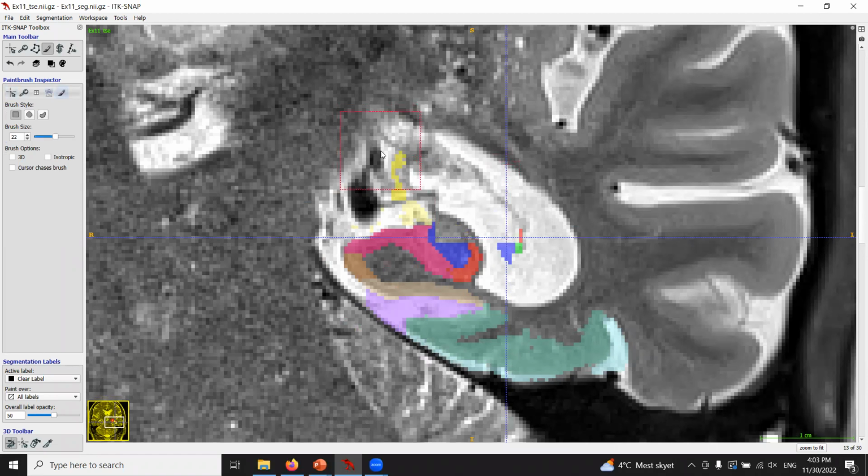Oh, I mentioned something real quick, Laura, about this particular error. So this is one of the things that hopefully will soon be taken care of, as there is an effort to try to provide topologically correct segmentation, and with the notion of using actually white matter and CSF labels. So that's hopefully not going to be an issue going forward. Oh, that's excellent. Okay, great.